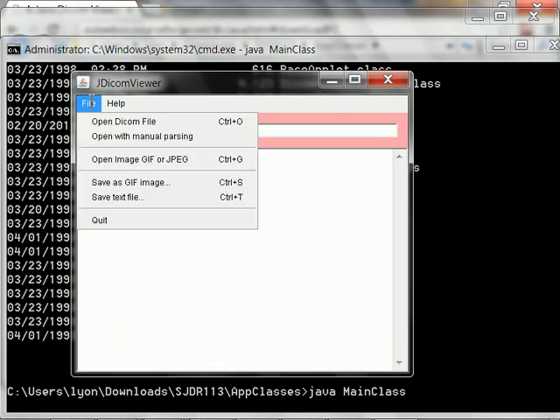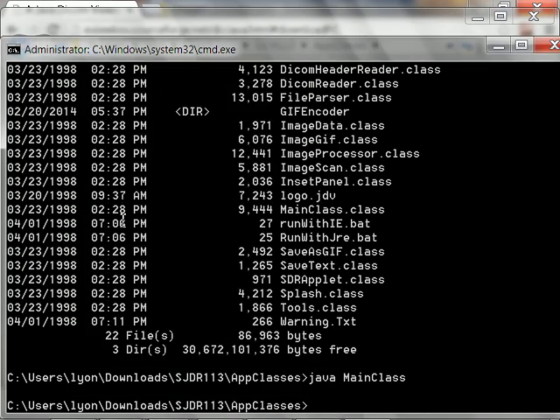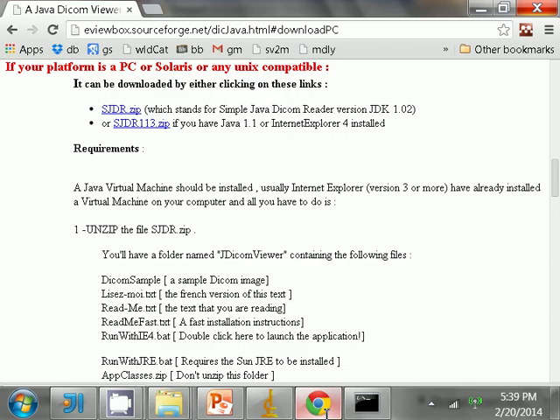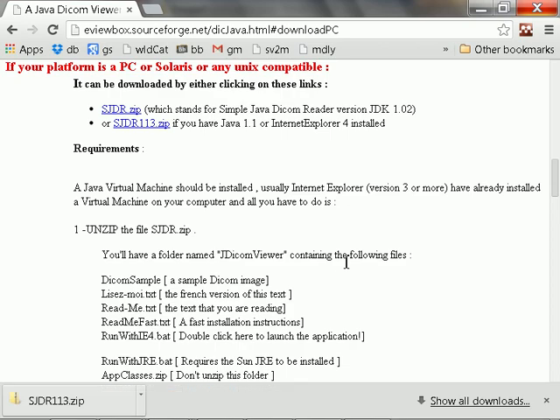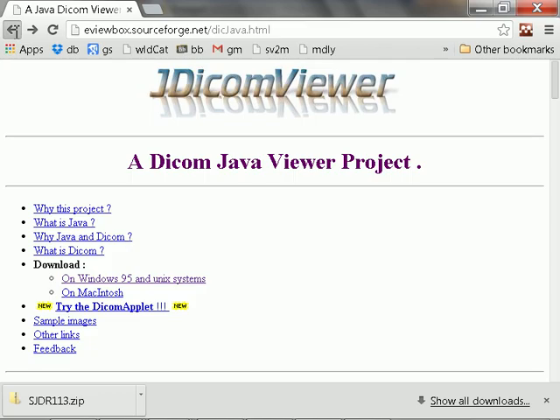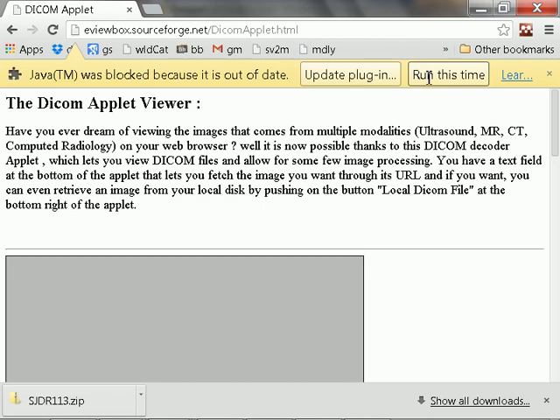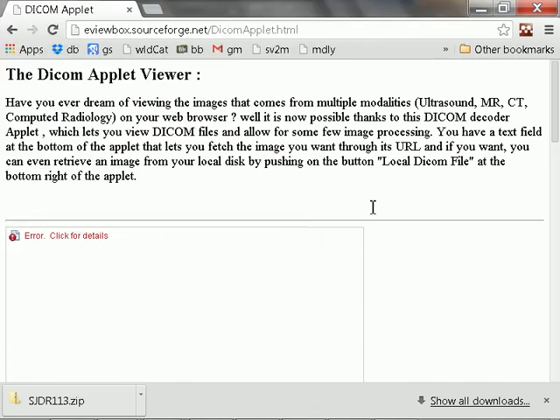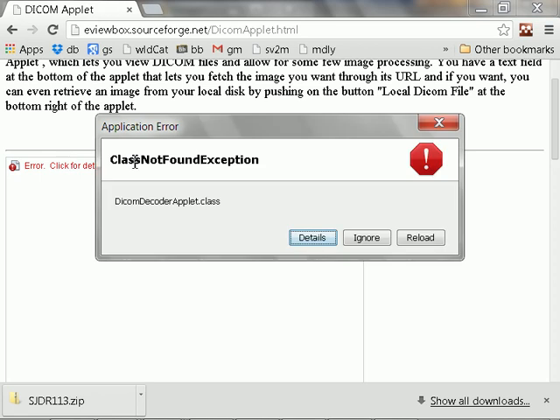Maybe it isn't a DICOM image. That's a problem. If it's not a DICOM image, we must be opening it with something else. Well, there's a couple. What's that? Flexible Image Transport System. You found another way to open it? No, it reads different types of things. You tested already for PNG and TIFF images? Yeah. What about BMP? Well, this thing is not letting me run.